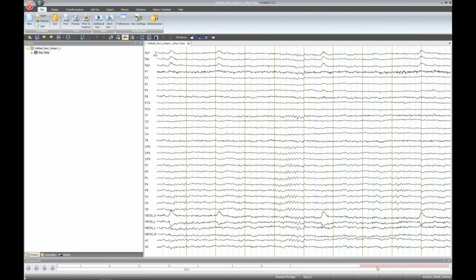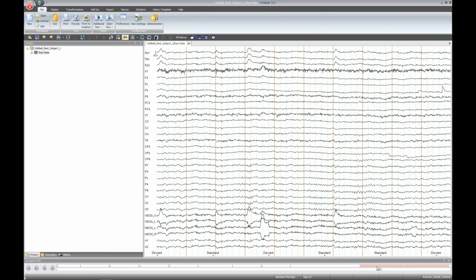And the second part of the dataset is recorded from an auditory oddball paradigm. An auditory oddball is characterized by frequently appearing standard tones and rarely occurring target tones, which are often called deviants. The elicited ERP component, that is P300, is stronger for deviants. In total, the data has 32 channels, including 4 EOG and 2 mastoids. It is recorded with a sampling frequency of 1000 Hz, and FCz was used as online reference.